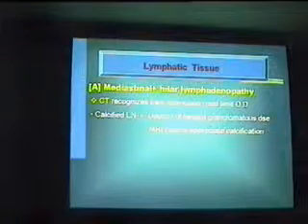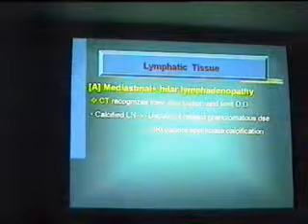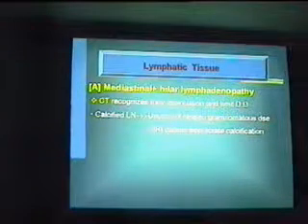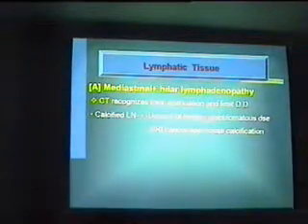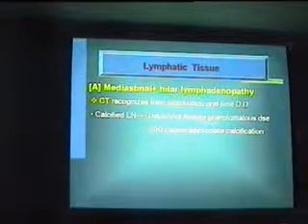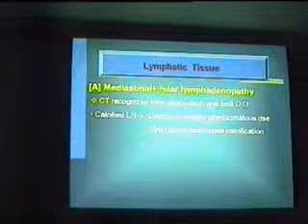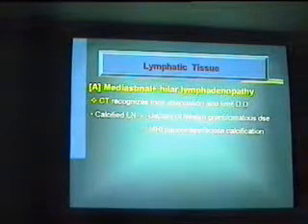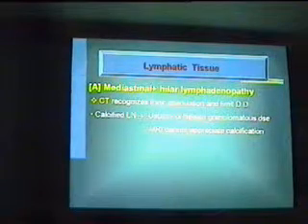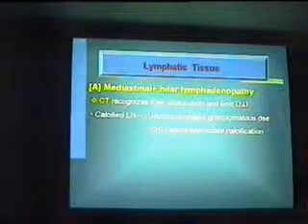الحقيقة ان السي تي بيساعدنا قوي في تشخيص الليمف نودز. First because of the size, second because of the appearance, third if there is any calcification or enhancement or areas of breaking down. بيوريني different groups of mediastinal lymphadenopathy اللي موجود. يبقى first CT recognizes their attenuation and limits the differential diagnosis.